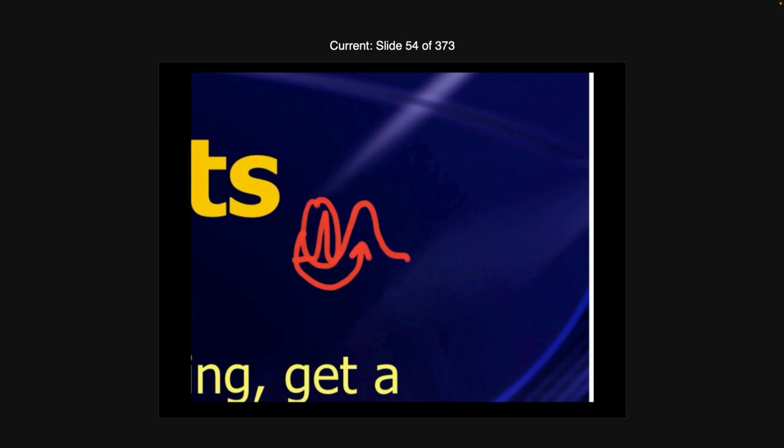That's too tall of a T-wave, and most people think of that as being hyperacute, and I agree. So, first type of hyperacute T-wave you're on the lookout for: if the T-wave is ever larger than the entire QRS, from top to bottom, if you can take that entire QRS and fit it inside the T-wave, that is ischemia until proven otherwise. As soon as ischemia, get your serial ECGs.